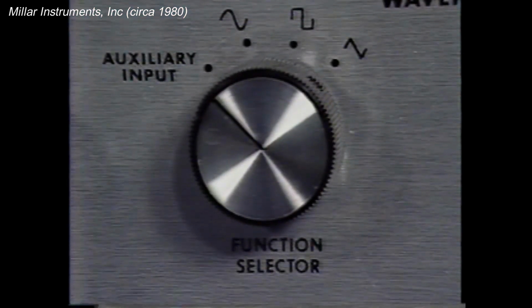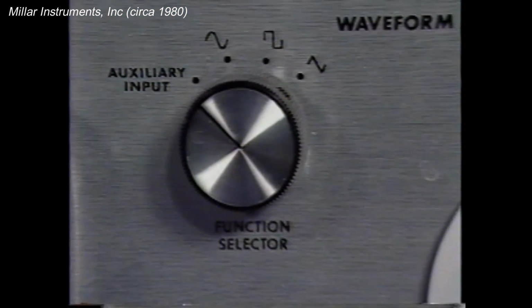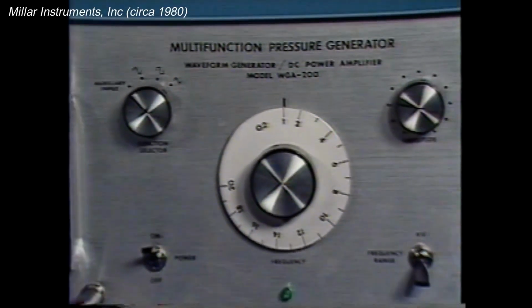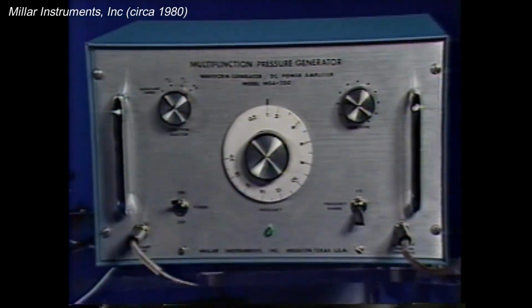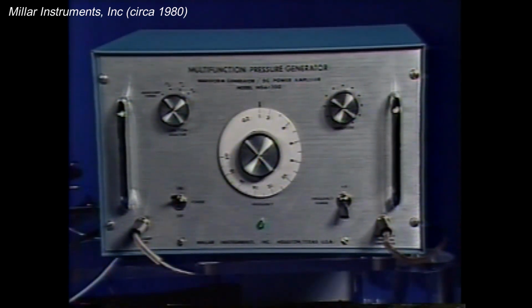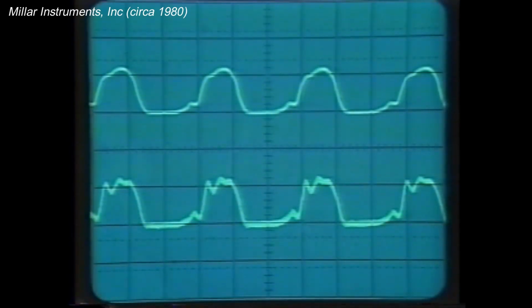We've taken a pressure waveform from a patient in the cath lab, digitized it, and put it on an electronic memory chip. In turn, we are able to play back the signal through the waveform generator so that the original pressure wave is being duplicated in the pressure chamber. We can assume this to be the heart of a patient from which that pressure waveform is being generated.